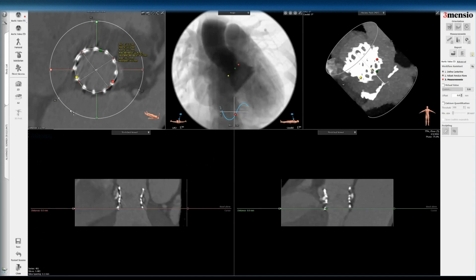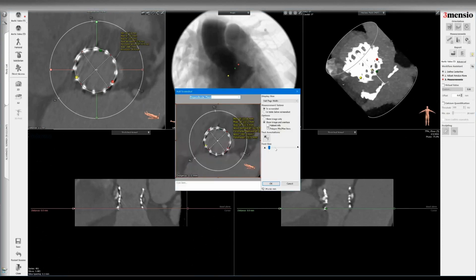But remember, the balloon expandable valve can be more expanded, especially if it's underexpanded. You can see that currently it is, because you can look at the frame dimension here. This is a 23 Sapien 3, and you can see that here it's about 22.5, so it's not fully 23. So there's potentially room to expand this more. And you can also see that this has some eccentricity to it. The valve should be more or less circular in a balloon expandable valve. So again, that is something to watch, and you can potentially make it more circular.